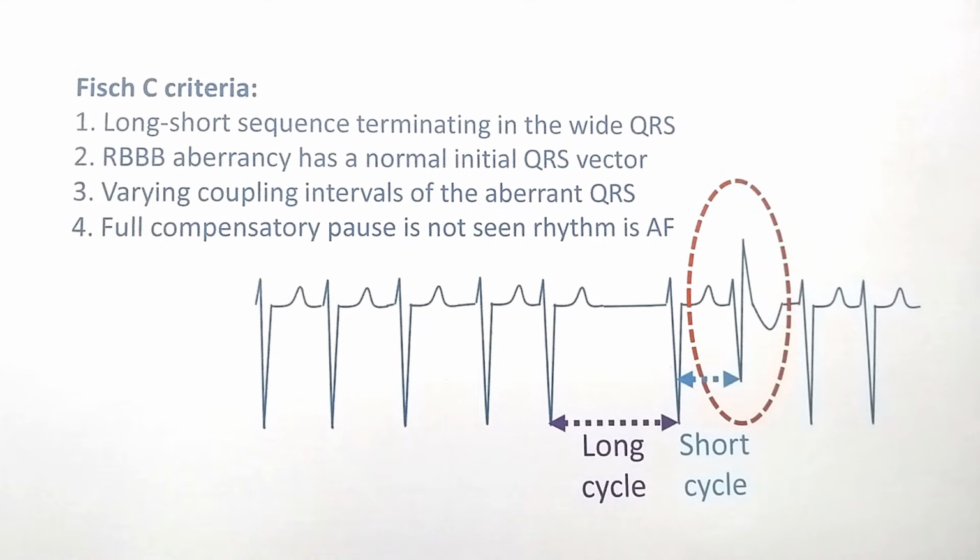That is because normal activation of the septum is from left to right, which produces this. The reason is that conduction down the bundle branch system is faster in the left bundle, so that septum gets activated from the left side to the right side. That is what is causing this. Correspondingly, in lateral leads, it will be a small Q wave.